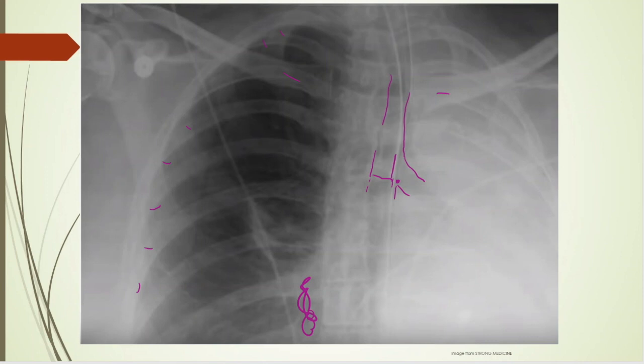And so, yeah, this patient needs that endotracheal tube pulled back really quickly. I'm surprised they couldn't pick this up clinically without having to pick it up on a chest X-ray. This is pretty bad, actually. I would say they need to hone their clinical skills a little bit.